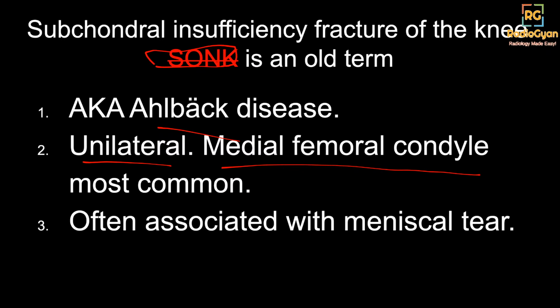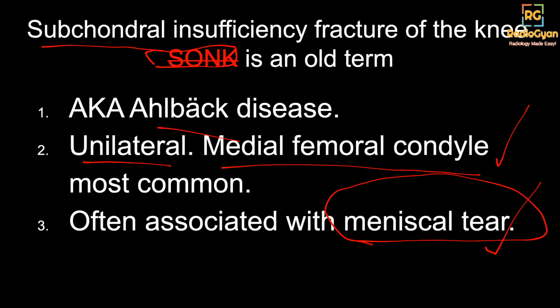Another important caveat is that it's associated with meniscal tear, so always look for meniscal tears in these cases. So remember that it's no longer known as SPONK or SONK. The preferred term is subchondral insufficiency fracture of the knee.